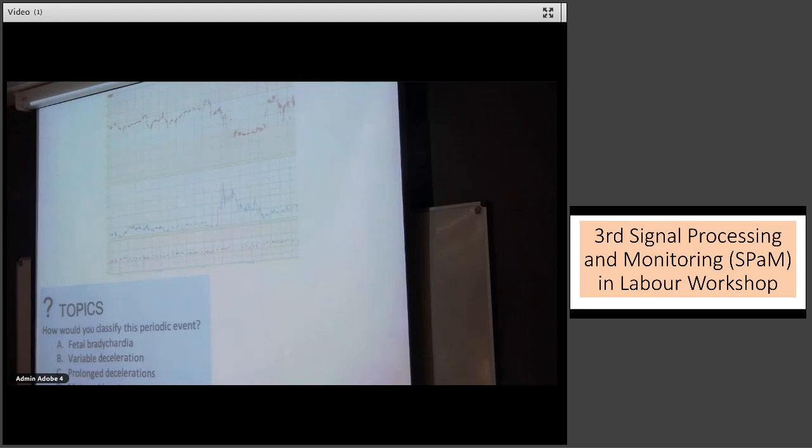Something like this: fever increases the maternal heart rate, so the maternal heart rate becomes more similar to the fetal heart rate, and decreased variability. Okay, so I agree with all the considerations regarding the pattern, but for me, it's very likely that it is a maternal heart rate pattern, and one good reason to support it is what Austin said.